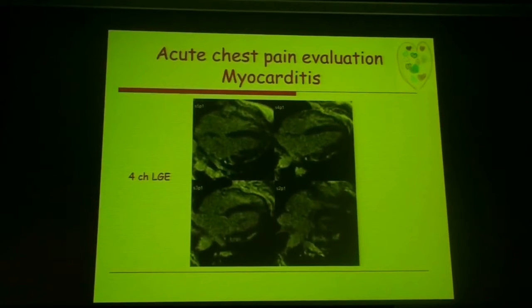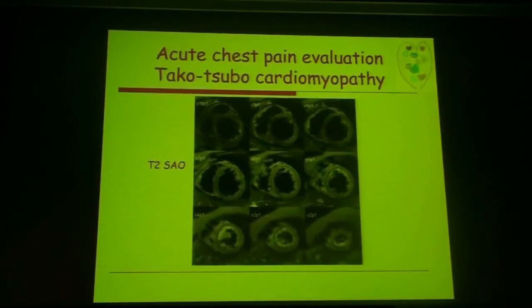Many times we do scan the patients even before they go into catheterization. Once we see such a pathology, there's no need to cath the patient. Okay, let's continue to a different patient.